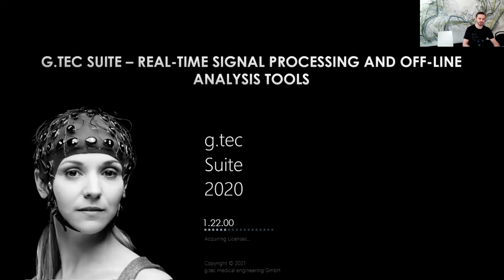And today I'm going to show you the g.tec suite. First of all, I'm going to go through the g.tec suite a bit, which is our tool that packages all the research interfaces. And then I'm going to have some live demos to show you how you set up an experiment, how you can do some data acquisition in real time, data pre-processing, and how you can analyze data offline after you've recorded it.